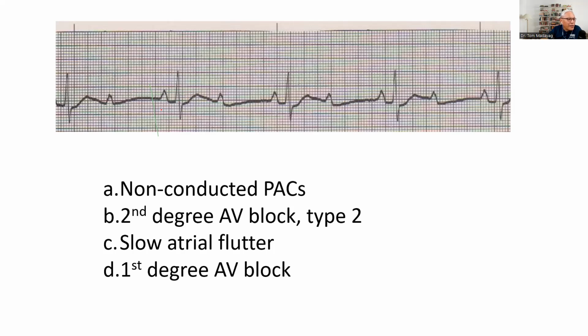We have a second degree AV block, and some of you said first degree AV block.